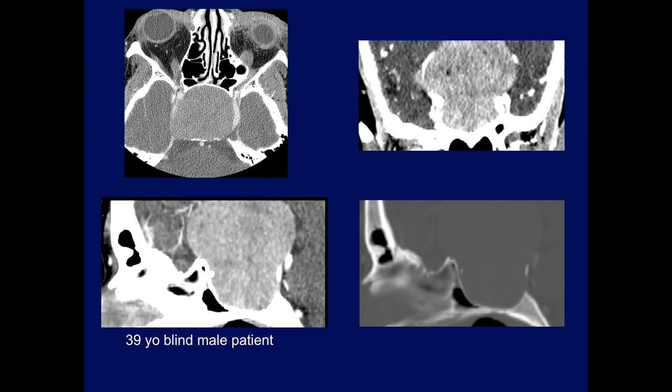Okay, here we have, let me put it mildly, a prominent lesion. Any possible diagnoses? Anybody? Okay, somebody mentioned meningioma, Ben, and Gino mentioned a meningioma. That's a very good diagnosis.